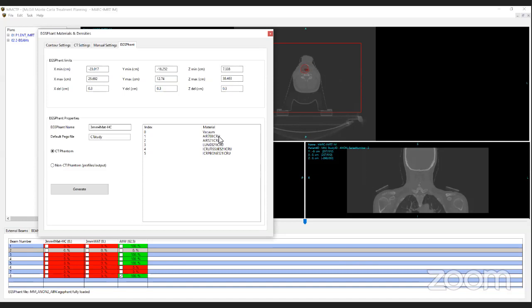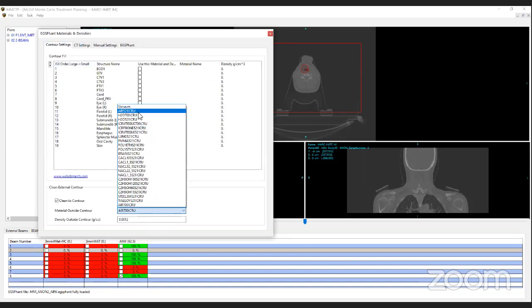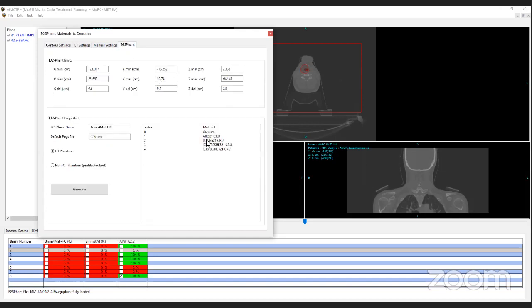And this is a problem because normally you would have a 521 PEGS file, one PEGS file that defines materials at that 521 energy range, and your 700 energy range would be a different PEGS file. So you wouldn't want to be in that situation. So I'll put it back to 521 so that everything in this material list is defined within one PEGS file.